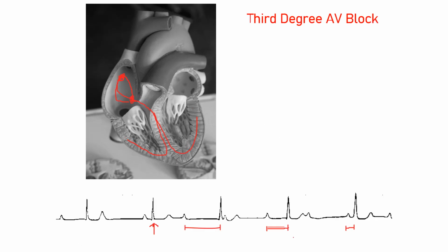In third degree atrioventricular block, there is a complete failure of conduction of supraventricular impulses to the ventricles. Ventricular depolarization is initiated by an escape pacemaker distal to the block. ECG shows wide or narrow QRS complex. RR intervals are constant, but there is variable PR interval.